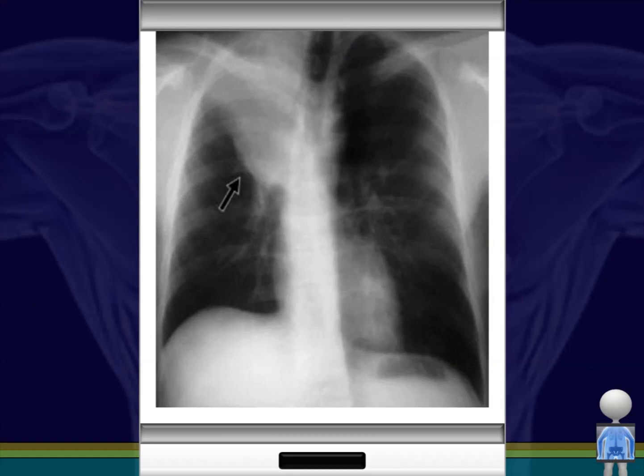So let's look at this. Is this atelectasis or pneumonia? There's two keys here that make this atelectasis. The first thing is, without a doubt, loss of lung volume, and this we see by the elevation of the right hemidiaphragm. So remember, we talked about diaphragm as part of something we were going to look at in chest x-rays, and this is another thing that can be. Flattened diaphragms, maybe COPD. Elevated diaphragms usually mean that there is lung volume loss, and so here we have an elevated diaphragm, and then this area up here in the right upper lobe.